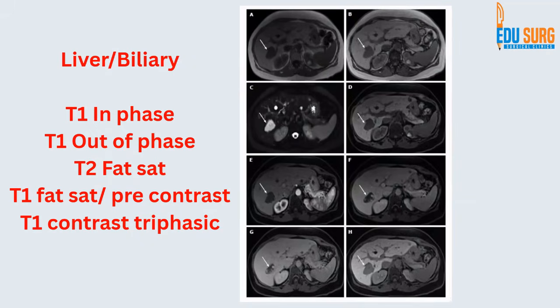So we will wait 30 seconds, or you can pause the video here and try to identify at least some of these images. If you have seen the liver MRI video and other MRI videos that we have put, I am sure you can identify at least 4 or 5 of these. If you cannot, we are going to discuss them in about 10 seconds from now. So you can just wait and watch how we identify the sequences.